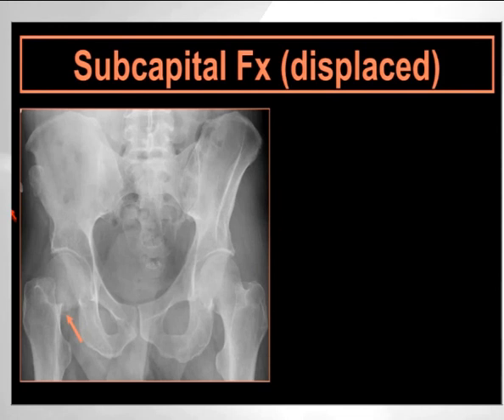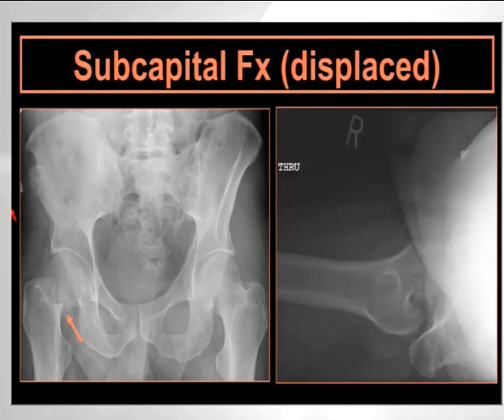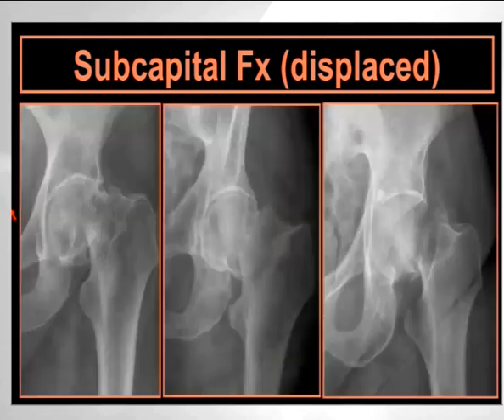Now, this is important to understand that the foreshortening doesn't mean that there is a lytic lesion, and it doesn't mean that there is a basicervical fracture. Most often, these fractures are subcapital, and because of the rotation and foreshortening, they would appear as basicervical or transcervical. This is the classic groin lateral view where you see the head rotated posteriorly.